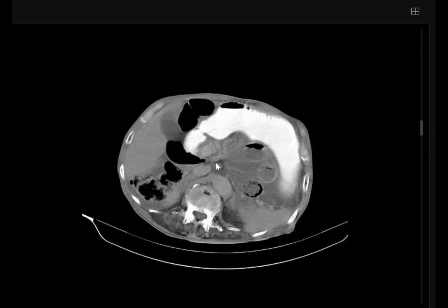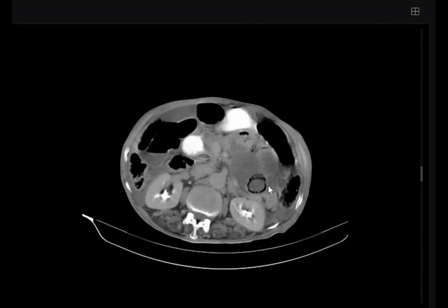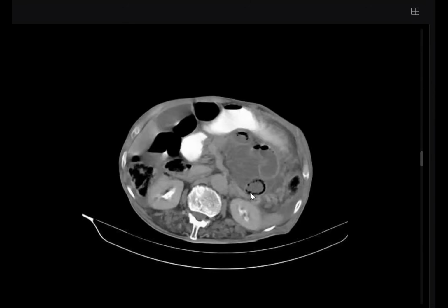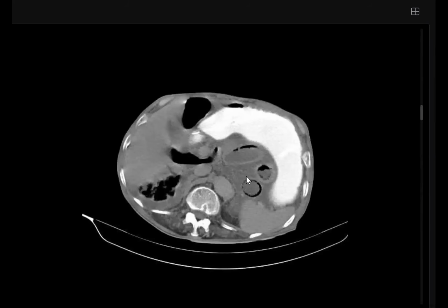Internal. The previous cases were external. External hernias can affect the groin or abdominal wall, like inguinal hernia, like umbilical hernia, like lumbar hernia. All these types of hernias are considered external hernias. But here, very good, we have clustered bowel loops, having their mesentery radiating to the center across the abdomen. And these clustered bowel loops look dilated, fluid filled with pneumatosis intestinalis. Excellent, my friend.